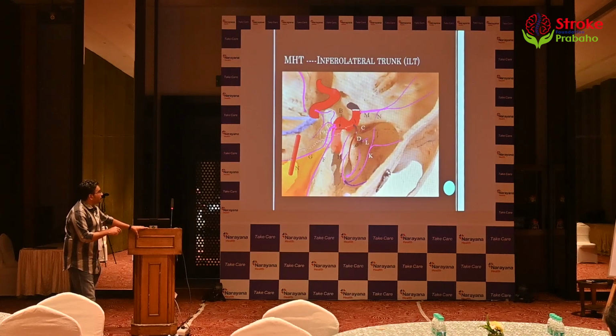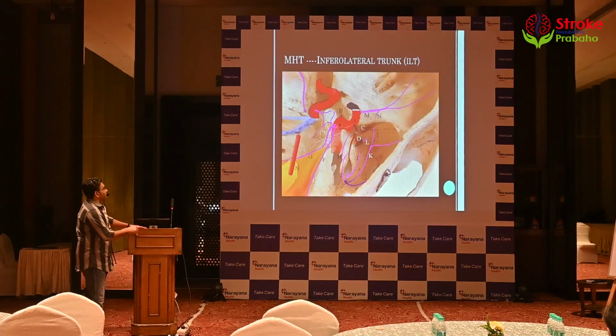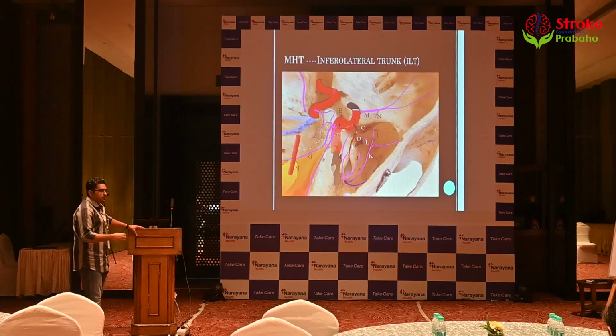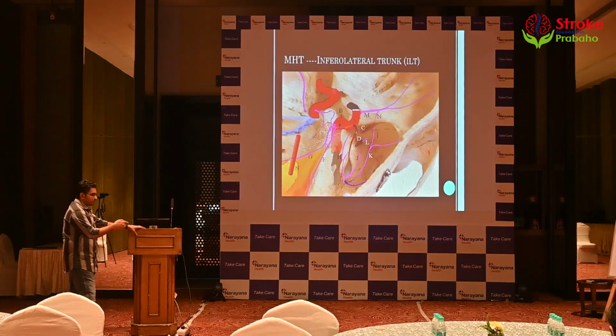It's a cavernous segment going laterally. So what could go there? It's the ILT. What could be B? Going posteriorly near the genu, it's the meningohypophyseal trunk. I think at the end of my lecture or discussion, if you're able to say ILT, MHT for me, I'll be happy, because it doesn't percolate beyond that. In 10, 20 minutes, we are in the age of shorts and Instagram reels.